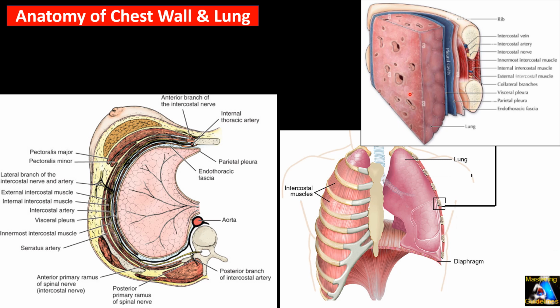And sometimes in COVID, it can help us to detect and diagnose many situations. For that reason, I am going first to start with anatomy, then we go with the normal finding of the lung in ultrasound, and finally we go to those pathologies that are very important and critical for the lung.